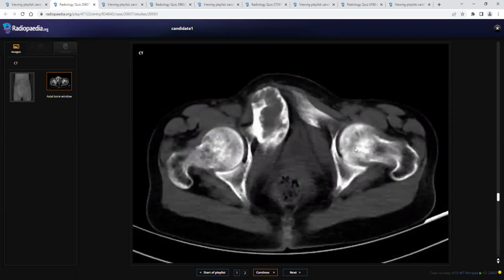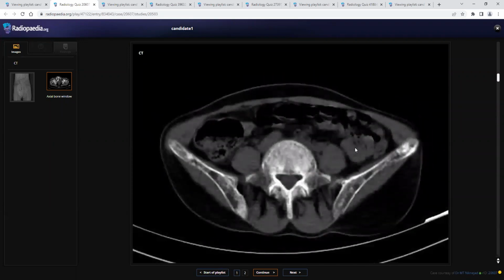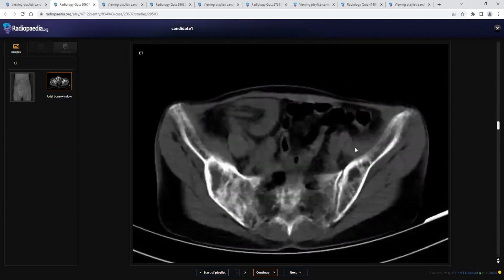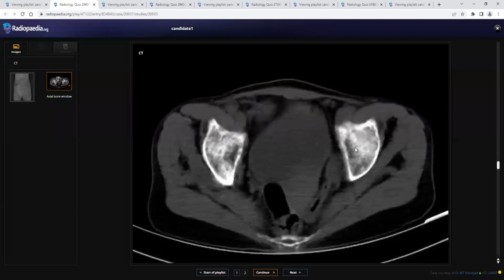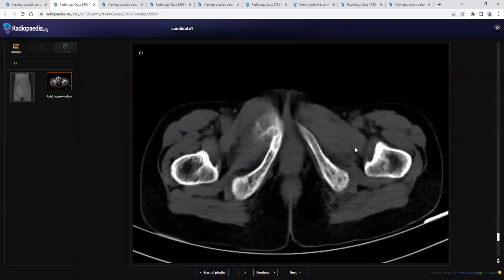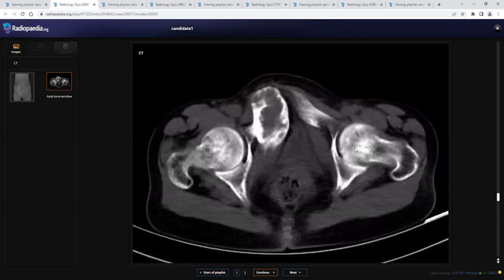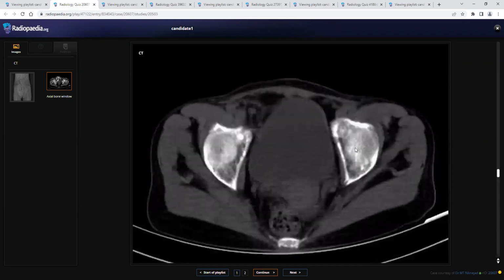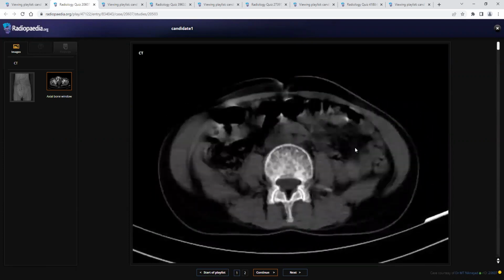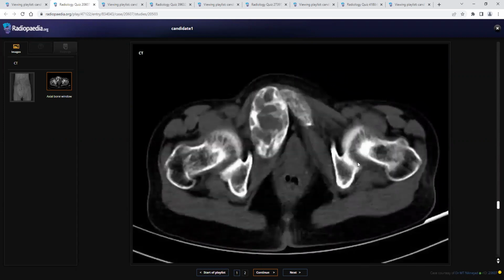Can you scroll up and see? There is a transplanted kidney noted within the right iliac fossa, with heterogeneous density of the examined bones. So reviewing these findings, I think the possibility of brown tumor must be considered in a patient like this. No other findings could be detected in this examination.